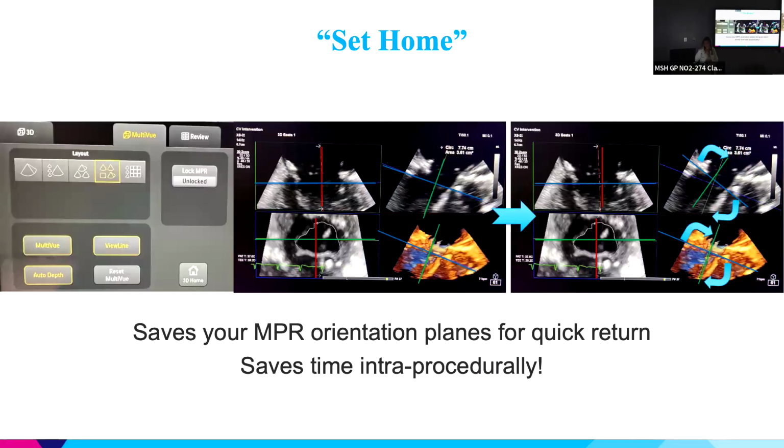You could do the same thing with color. When you're trying to do this fast and repetitively, for those of you that end up doing structural at whatever institution you go to, I just want to educate you that there is a 3D home button. So you can save home. And so like say, okay, 20 seconds, but I don't have time to do 20 seconds. If you do it at the beginning, when the patient is intubated, you're getting a Watchman or something done, or they're doing a mitral clip, you have 20 seconds in the beginning of the case, you can set up your planes and hit 3D home, which will save your planes for you.